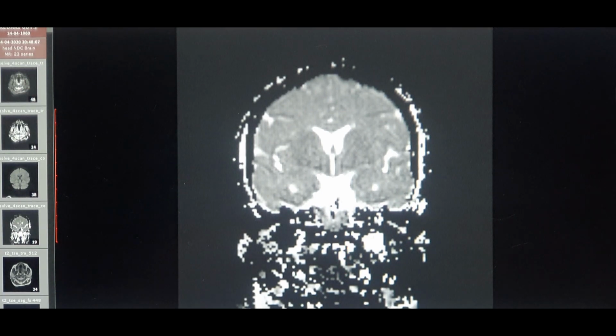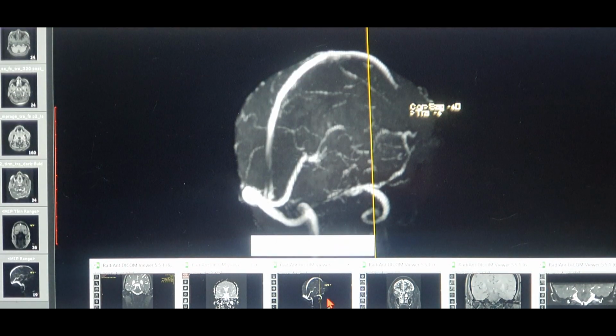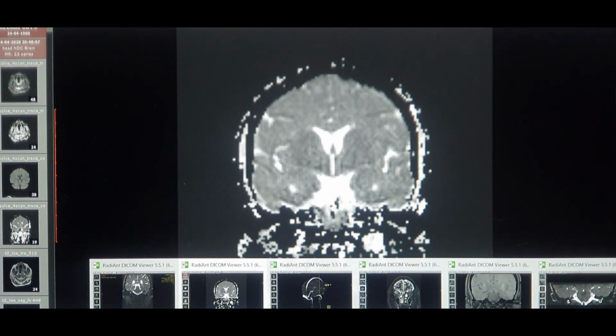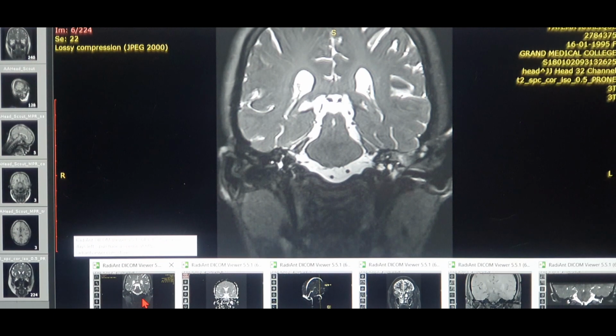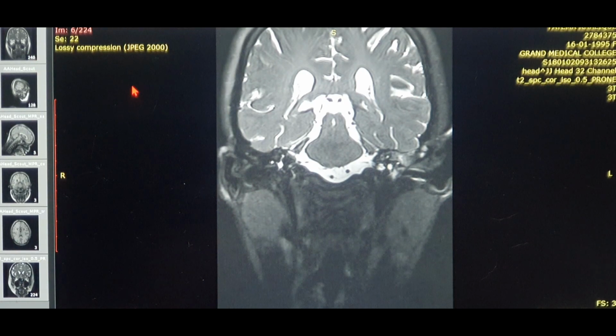So next time you go, you can discuss all this again with the radiologist, and also about the MR venography as well. Now, moving on to one more variant, the MR cisternography. I had a patient who had a CSF leak. Wait a second. I guess she's the one. Yeah. So there was a female patient. She had a complaint of CSF leak, spontaneous CSF leak.